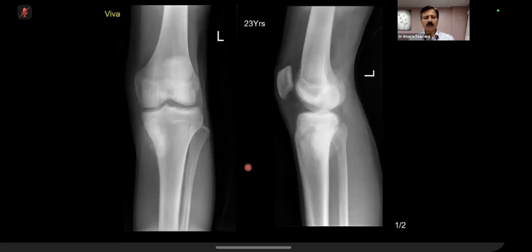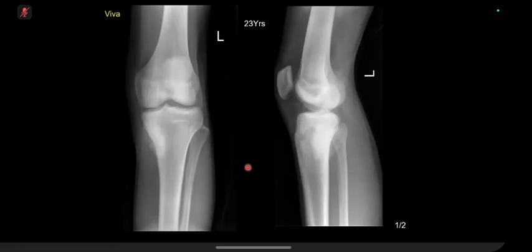How will you describe it? We know it's an osteosarcoma, just for practice of your description. Over to you. So the lesion is ill-defined with a wide zone of transition. It's eccentrically located in the medial cortex of the left proximal tibial metaphysis. There is osseous matrix and an aggressive periosteal reaction.